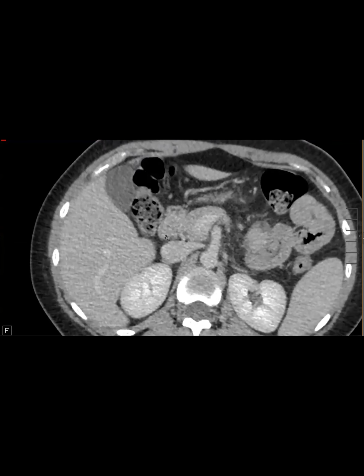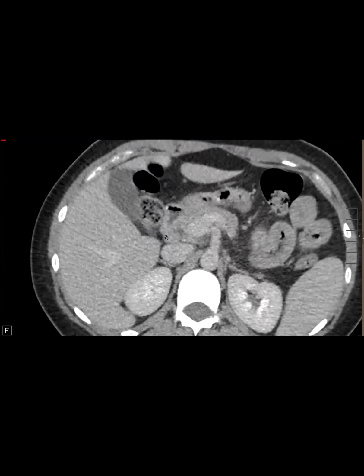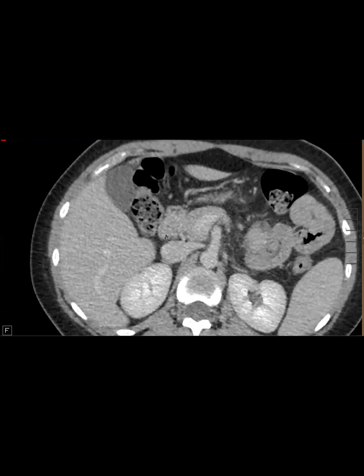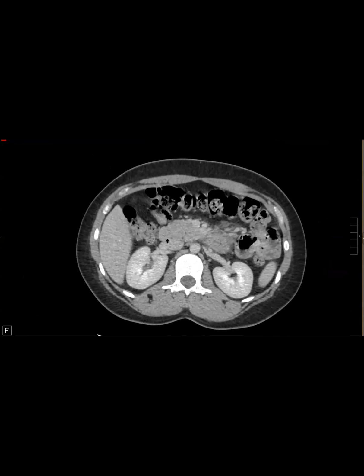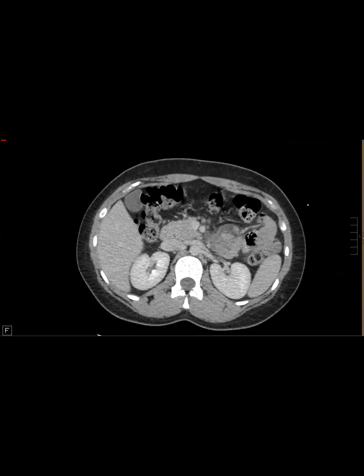You may not. I don't know if you can fool yourself into thinking there's a duct in there. But anyway, with all the inflammation around it, I would have put heterotopic pancreatitis. I didn't appreciate the mass at first, but once you appreciate that there's a mass along the bowel wall, then you have to come up with a reason why you're getting a mass with that much inflammation. Yeah, so something to think about when you see a proximal bowel mass with inflammation is ectopic pancreatitis, which is what this was.